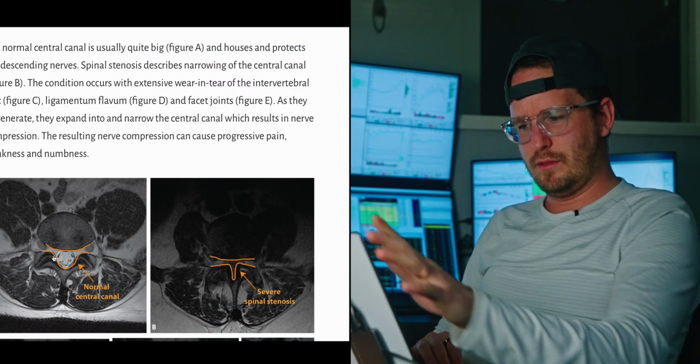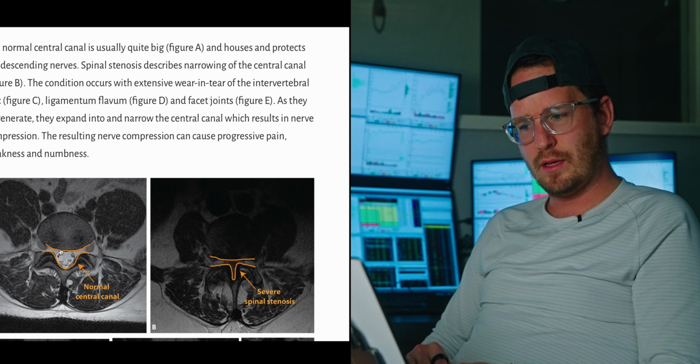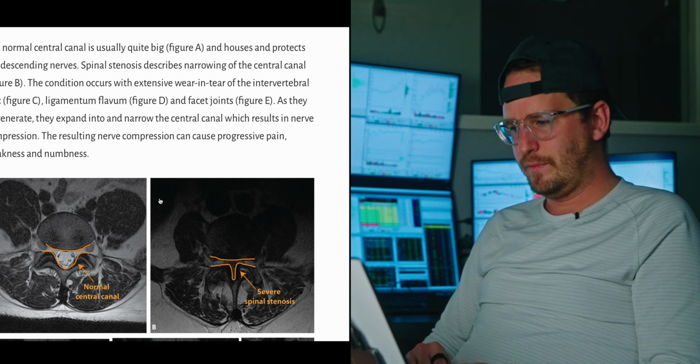Disc is a flexion injury. Stenosis is an extension injury. So leaning backwards versus leaning forwards. Here is the normal central canal. Nice foramina, nice foramina, nice canal.